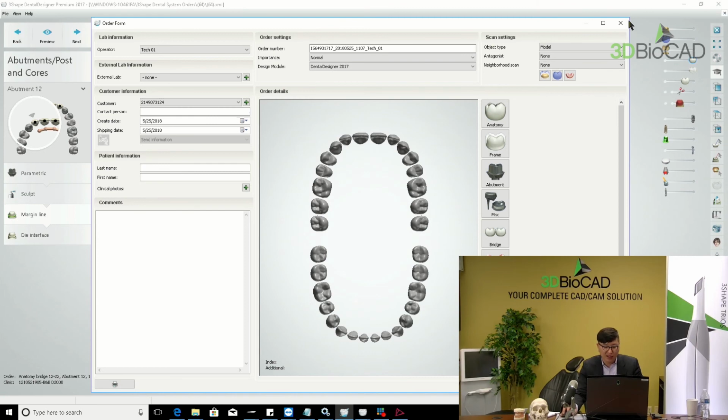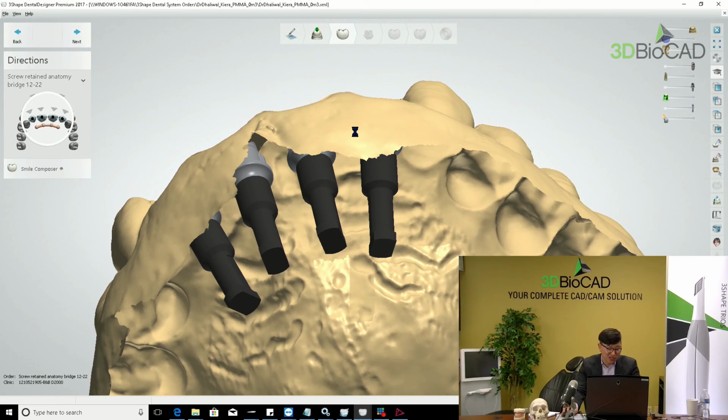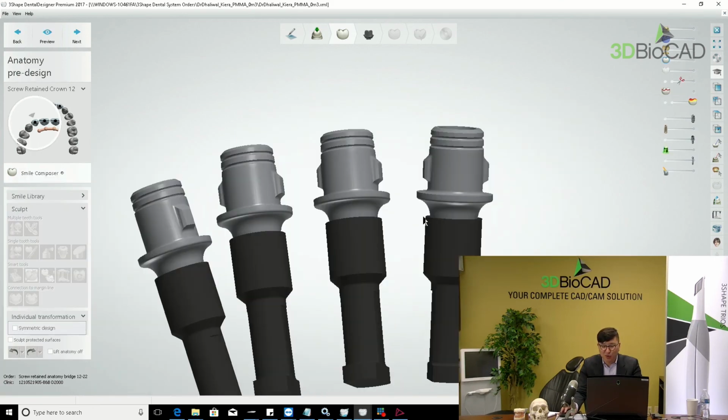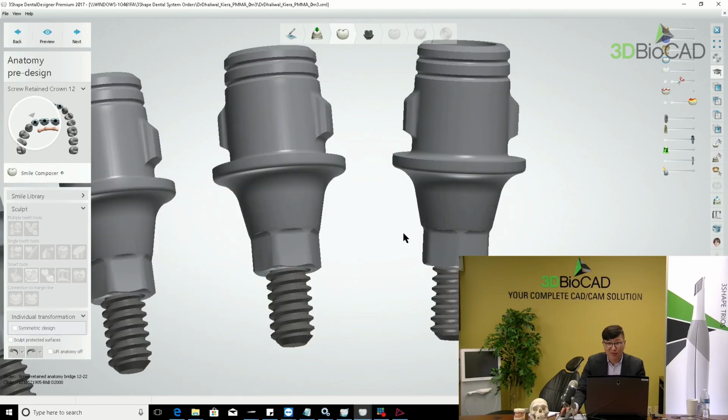And if again same case, but just let me show you this and then let's finish this case. If we go with a titanium base option, of course we want to have a non-engaging Ti base, or I'm not sure if I can say that or not, at least we can cut out the bottom of the hex area, the engaging area.